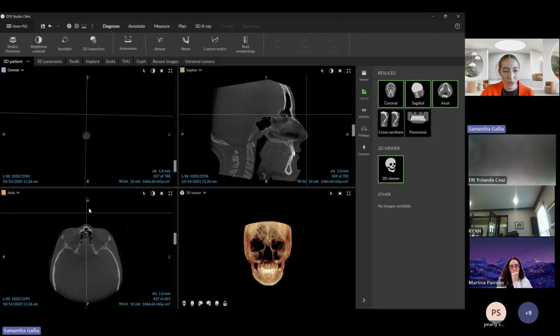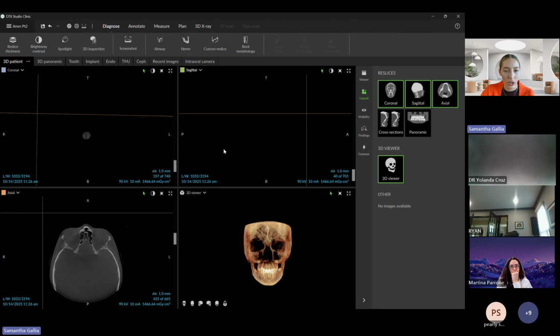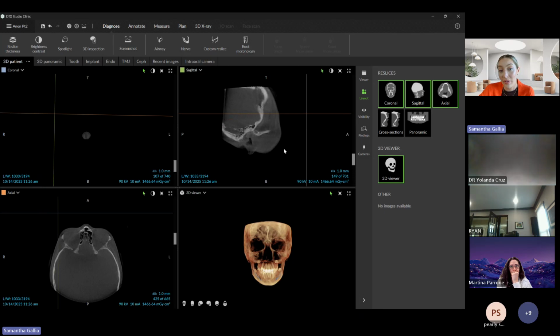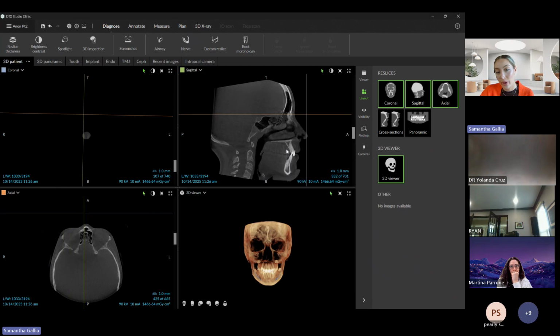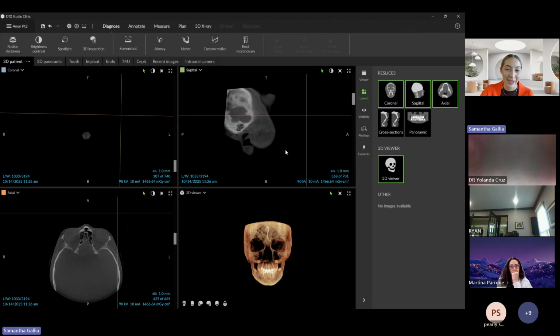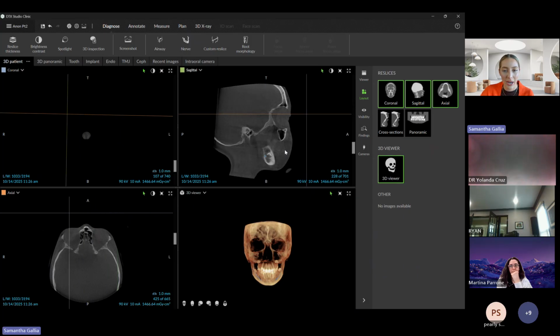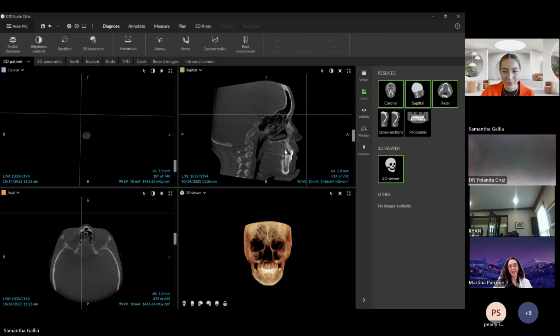That's the last one that I look at. So I'm going to grab and start all the way over on the right portion of the scan. And I always go right to left and scroll through and then scroll back through left to right, just looking at the structures on my list. If anybody has any questions about that, I am happy to go further into detail.